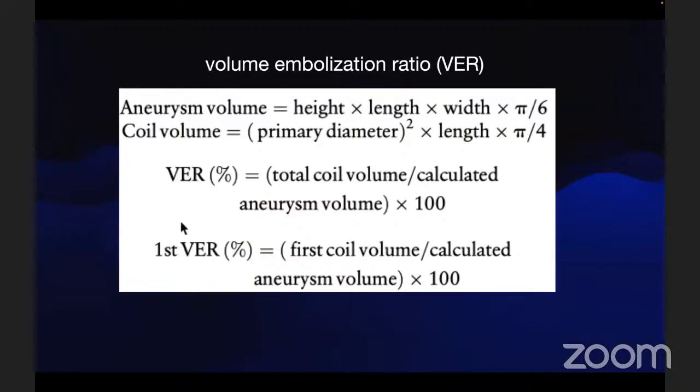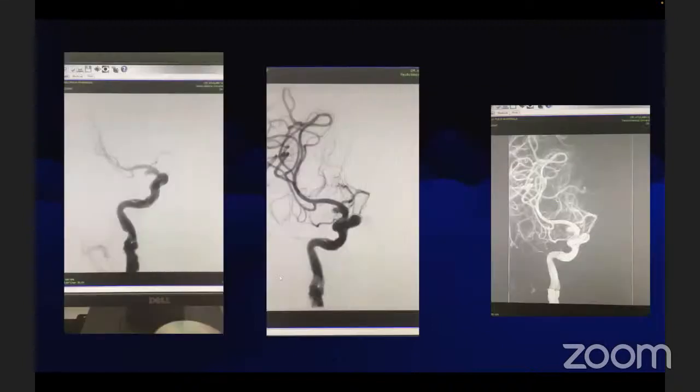In this case, we did simple coiling, sir, with a regular microcatheter. The only way to present this case is as a dysplastic artery. You went through which one, the bigger lumen or the stenotic lumen?